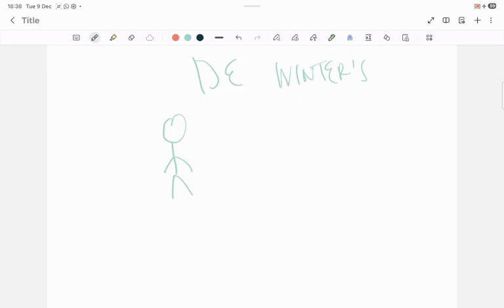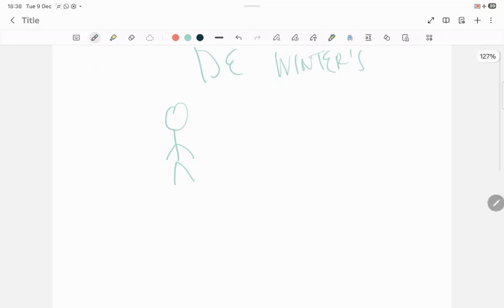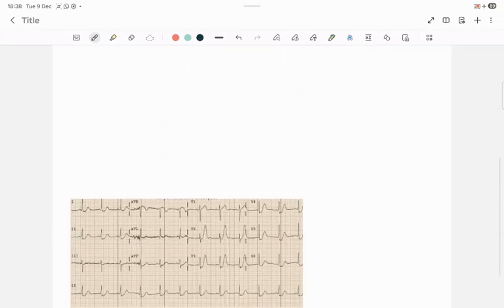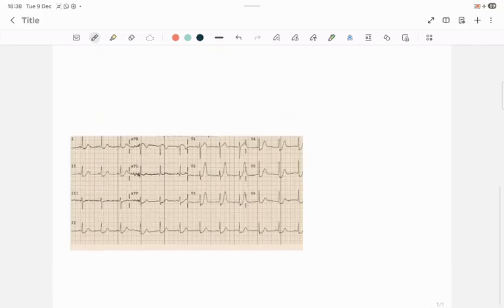And I'm going to show you this ECG in a second. But get it, in terms of clinical context, this particular gentleman was presenting classically. In terms of the ECG, no ST elevation. And I will show you the ECG. And this is the ECG, to be fair. You could see that this is not a particular ECG, but this is a similar ECG.